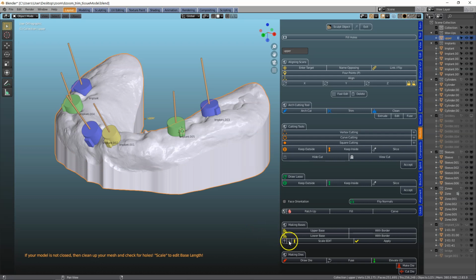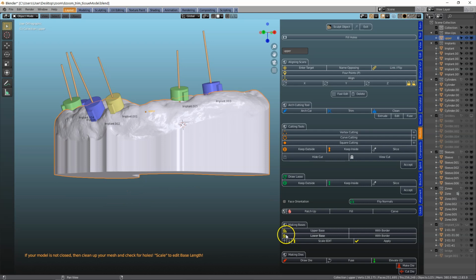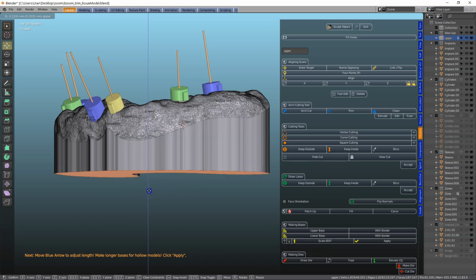And then we're going to bring this down a little bit. So we've got these new arrows in our model designer, which we never had before. So if you have the old module, you can update, or you can use a scale and simply move this up and down.